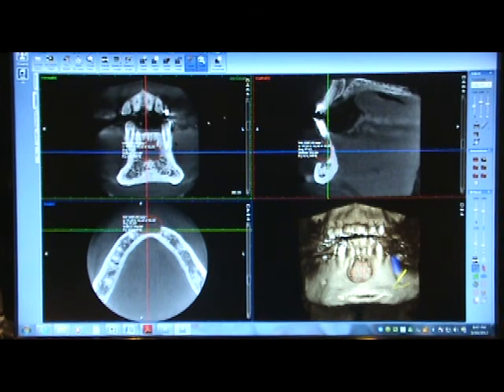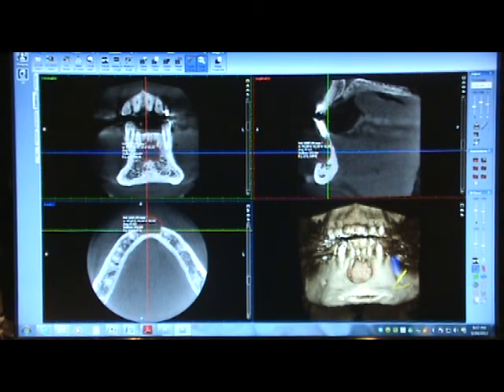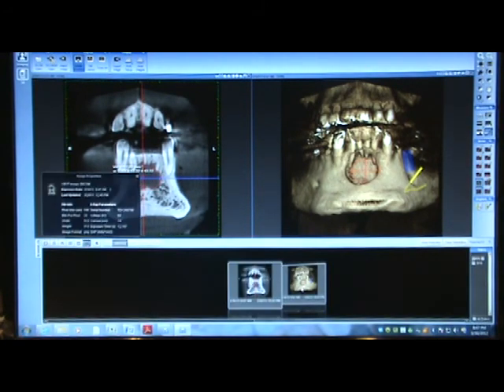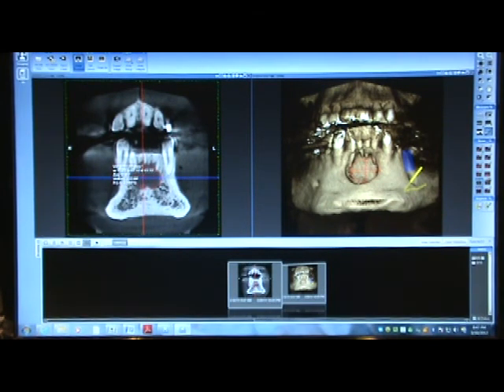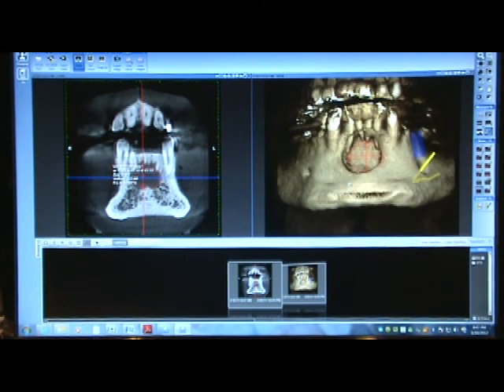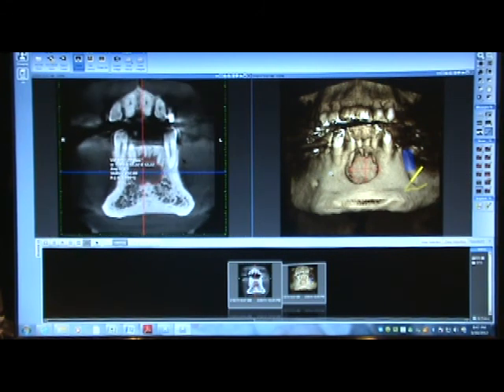Over here, if you want to take an image at any particular time, you hit the little camera in the corners and it'll save the image for you. You can go up to the top left and go 2D imaging, and there your pictures are saved. You can hit the bottom left button here and they align them all up down here for you. And it gives you the info. Over here it allows you to view, left toggle wheel in and out for detail. There's a little measurement ruler if you want to measure.